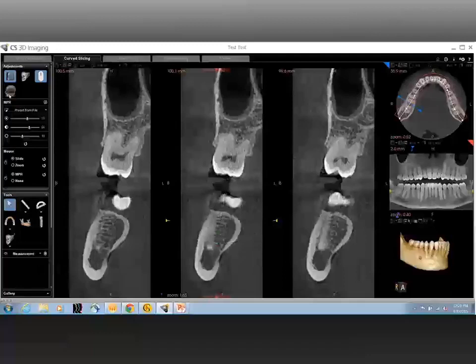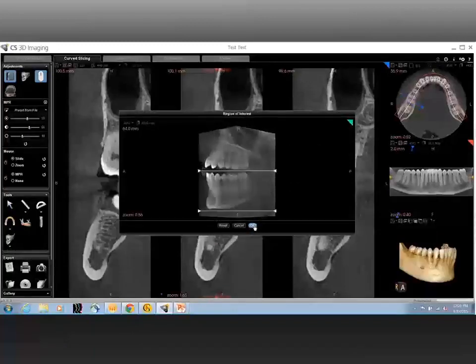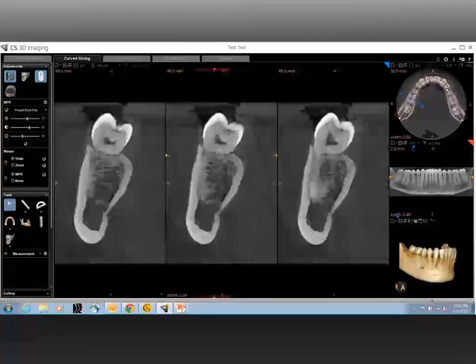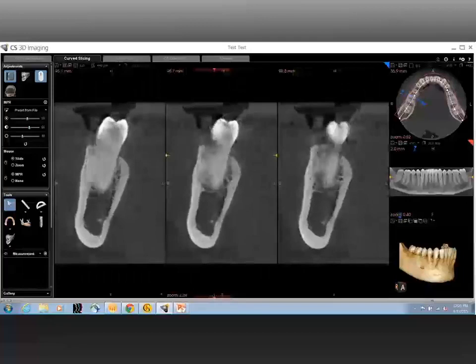Now, once the angulation of the ridge has been analyzed, and I again emphasize it does not necessarily have to be in this order, you have to critically also view the morphology of the ridge. So the morphology of the ridge is nothing but you have to identify all the borders of the ridge, and as you all know very well, that borders can change. The shape of the morphology of the ridge can change, especially the crestal bone.